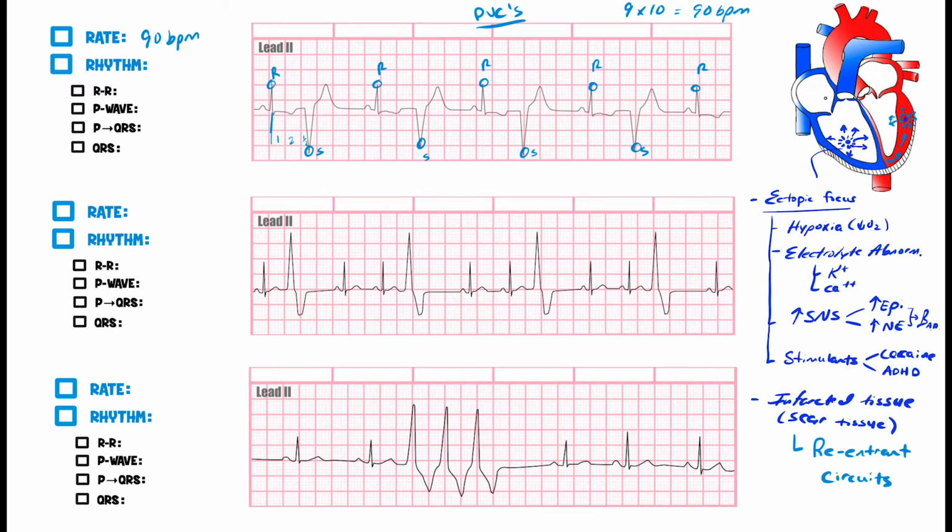Then we go to the next one. So we're going to go to this point about here. So we're going to have 1, 2, 3. Ooh, it's already off, right? So that's definitely off. We move to the next one. You go from here. You got 1, 2, and you got about a half. Then you got 1, 2, 3, and again, I got about a half here as well, okay?